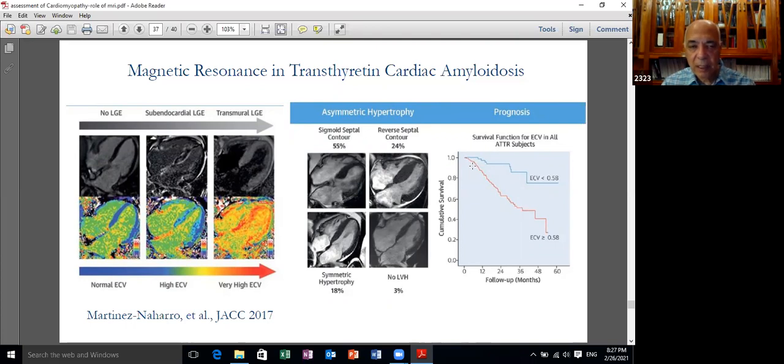Under these circumstances, you can't use gadolinium to find areas of fibrosis or areas of necrosis or areas of expansion of the interstitial tissue, but you can use mapping, because in mapping you don't need a dye. You need this method, these specific protocols, the Look-Lockers and others. Under these circumstances, you can do the job and you get the diagnosis without the use of a dye.